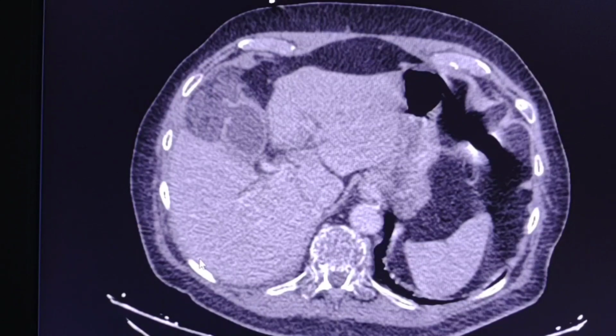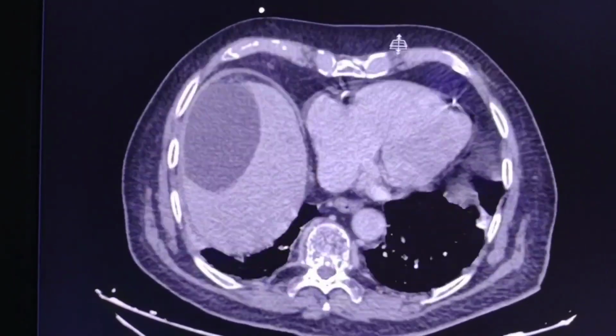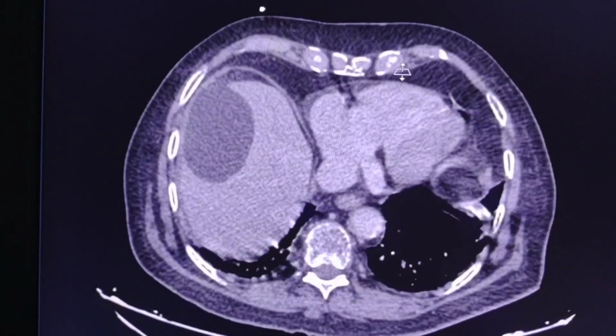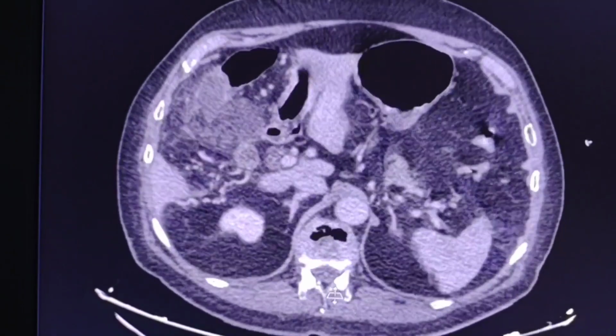This is a case of an 86-year-old female patient who presented with significant abdominal pain, right upper quadrant tenderness, Murphy's positive, raised inflammatory markers. She was clammy with fevers, abdominal distension, diarrhea and vomiting, and further evaluation was performed with a CT scan. So let's have a look. Clinically, the patient was suspected for cholecystitis or perforation. So let's have a look.